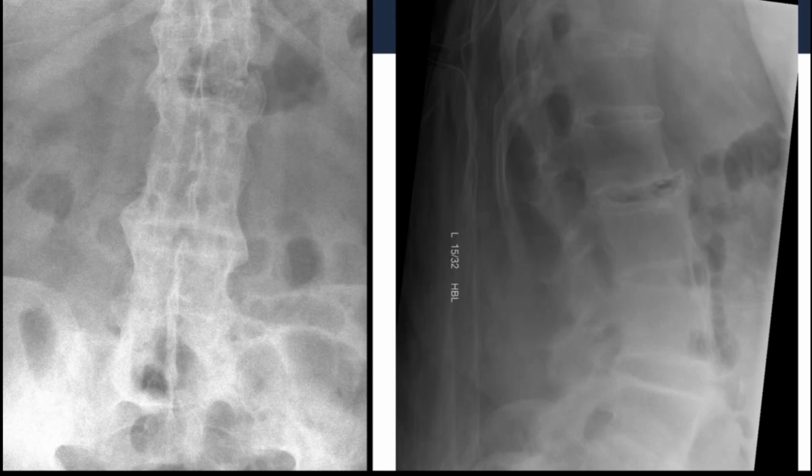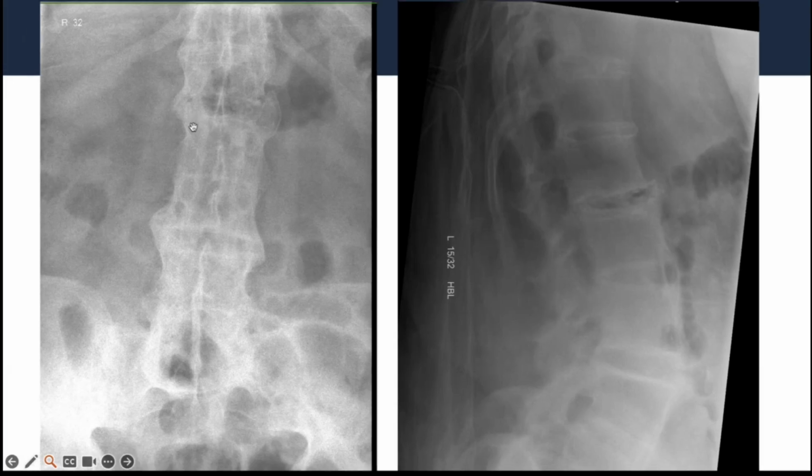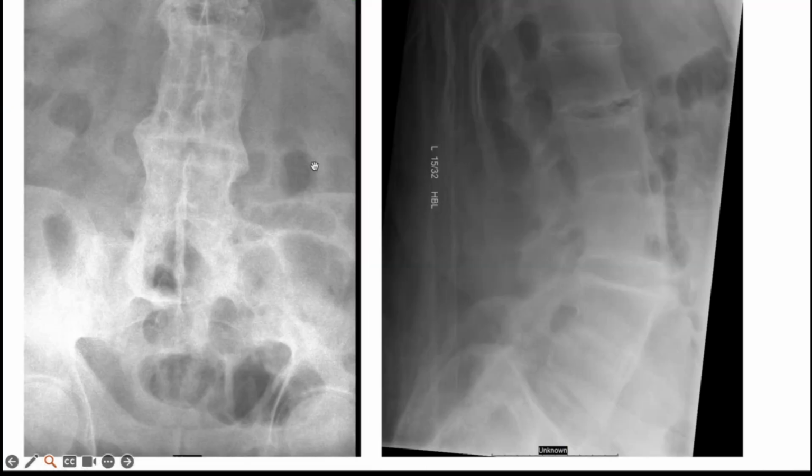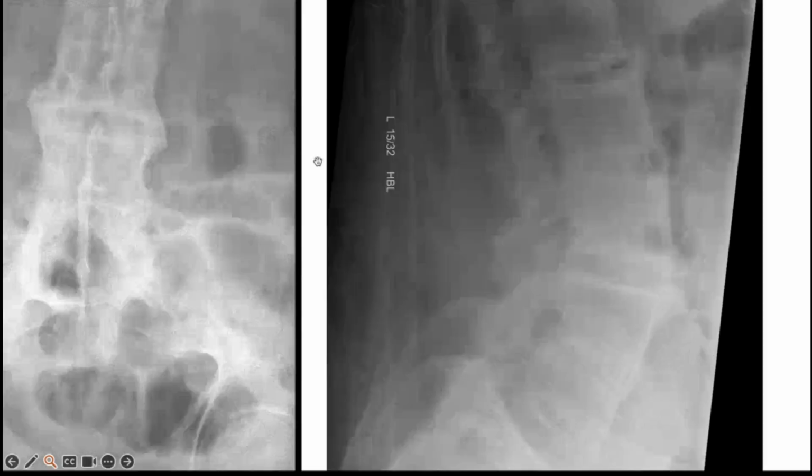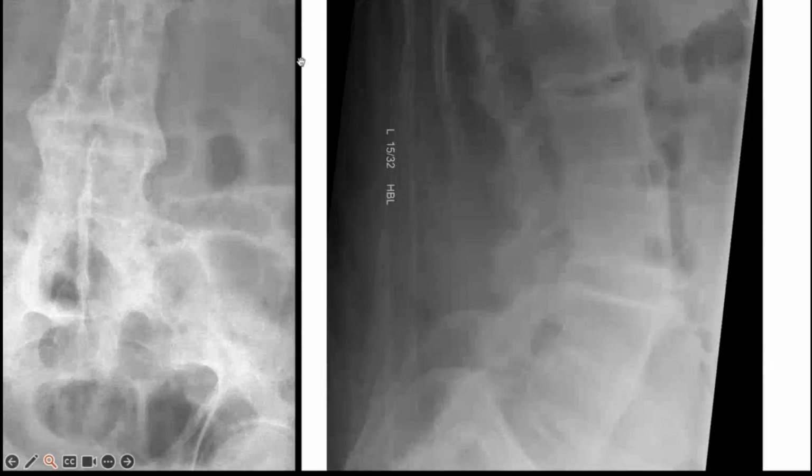I mean, it's a very subtle finding. I was going to say, osteophyte visible. Yeah, after you, Abigail. Yeah, and then I was going to say, if I'm looking, we've got L5, L4, there seems to be a bit of wedging on that L4 maybe. Yeah, possibly. And then maybe some posterior displacement of L5, L4, L3, L2, of L1 and L2.